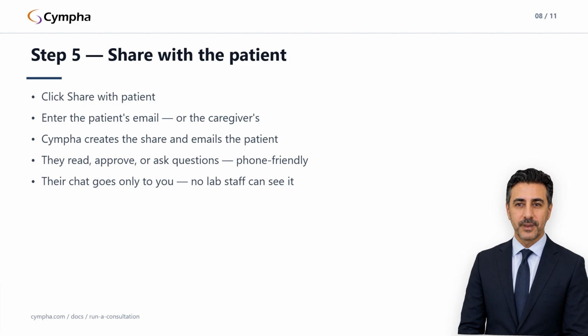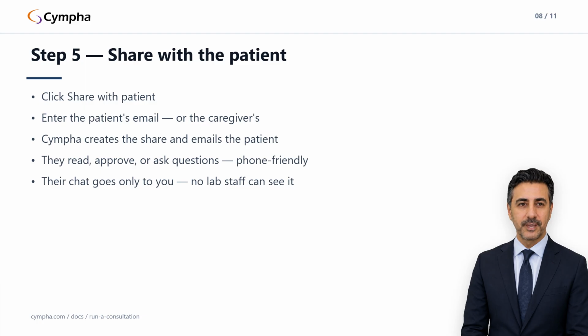Two things to know about what comes back. The patient chat thread goes only to you. No lab staff can ever see it. And their response surfaces in two places: the patient review section of the consultation page and the case activity log. So you'll know without chasing anyone.